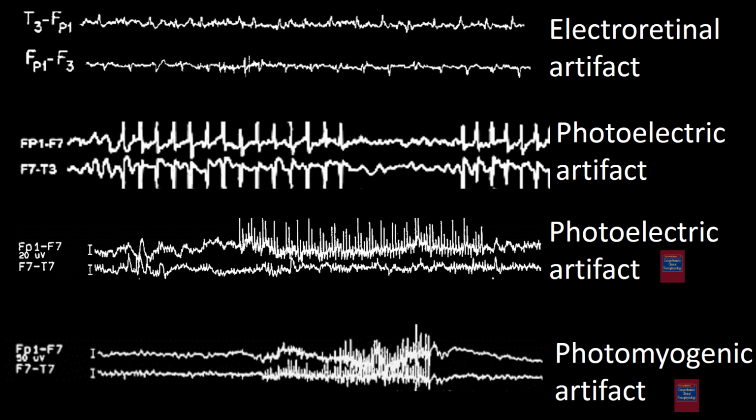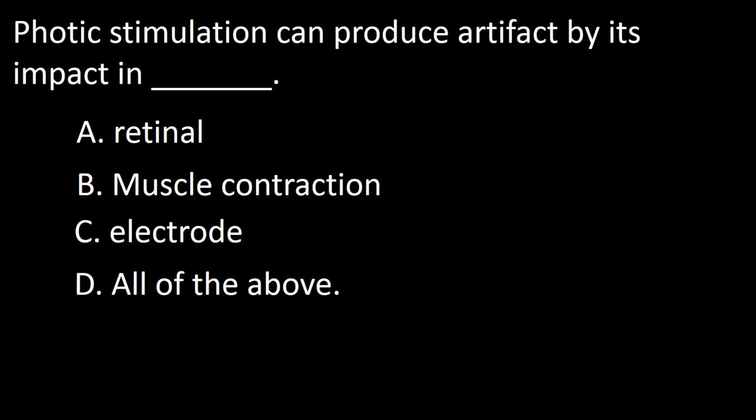This final figure I'm introducing is a photomyogenic artifact. So the answer to this question is all of the above. Thank you.